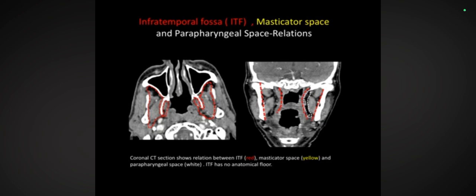It extends from the pharyngeal mucosal space up to the medial wall of the mandible. So what all structures will you see when you go from the pharyngeal mucosal space up to the medial wall of the mandible? You will see the pharyngeal mucosal space, the parapharyngeal fat, then the medial pterygoid or the lateral pterygoid, depending on which level you are, and then the medial wall of the mandible. That's it. It ends there. Now, I started from the pharyngeal mucosal space, included the fat of the parapharyngeal space, included the medial and lateral pterygoid muscles, and reached up to the medial wall of the mandible. Some bit of the fat in the retroantral space also.